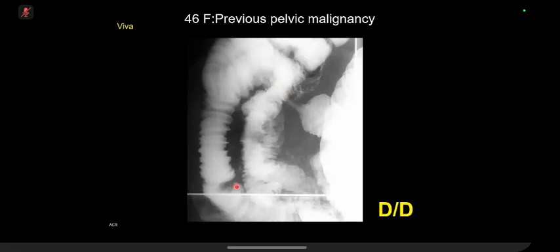On the spot images from a barium meal follow-through, there is thickening of the mucosa, and I can see the valvulae conniventes where you've marked with the pointer, and some thumbprinting as well. Thumbprinting is also very good. Yeah, mucosal fold thickening and some irregularity in the mucosa as well.